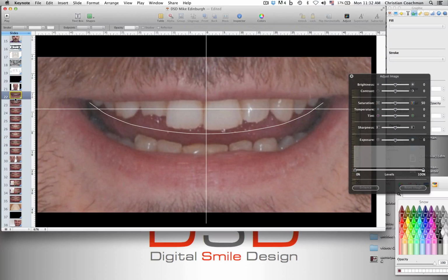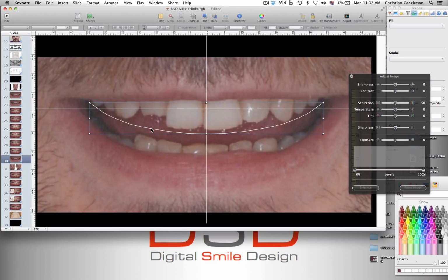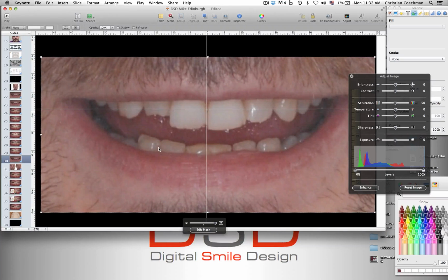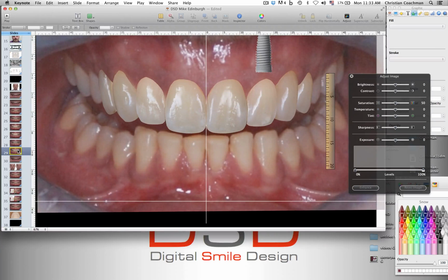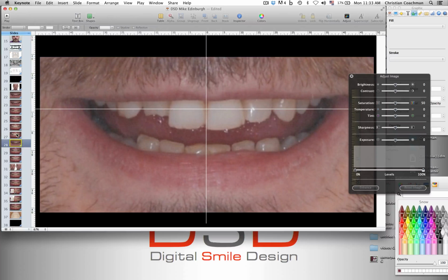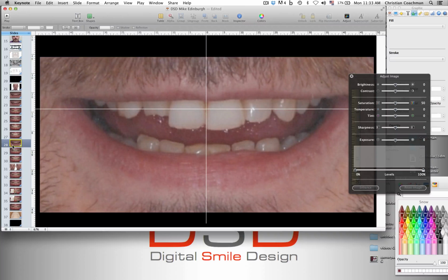Now if you want to overlap over this picture, we don't need these lines. You want to bring the teeth from, oops, this is not where I was. I want to bring from here to here. So we copy all of them, copy, paste over here.